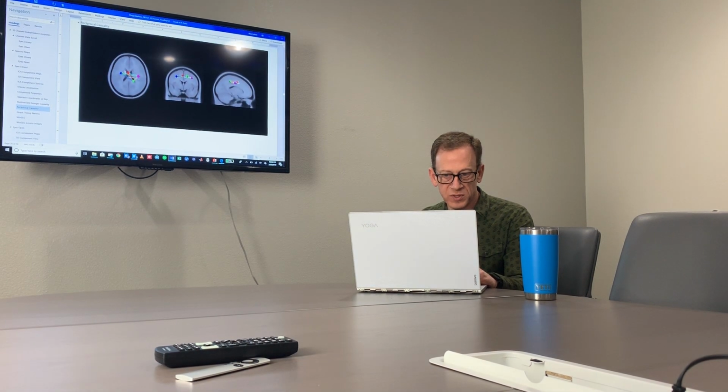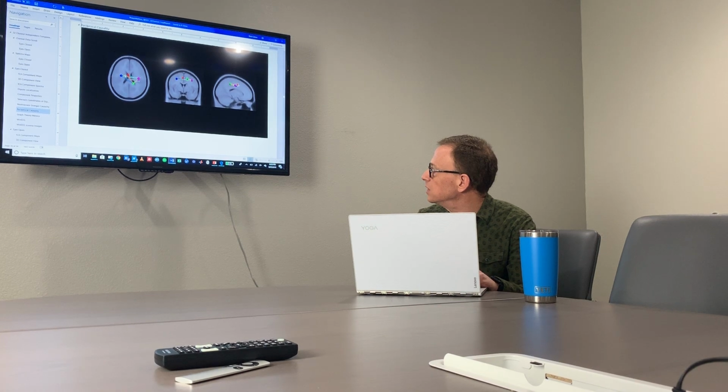So that will be across this area in here, if you can see that little cursor, and combine that with areas in the parietal and temporal lobes over here. So the protocol would basically cover those areas. It would be encouraging increases of coherence and trying to decrease the beta activity we saw in those analyses. So that's how we look at this.